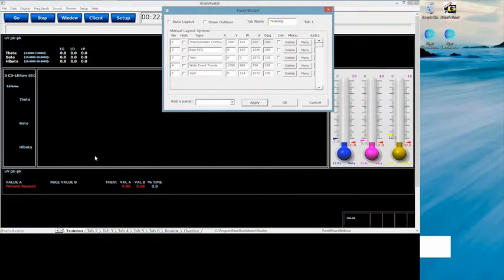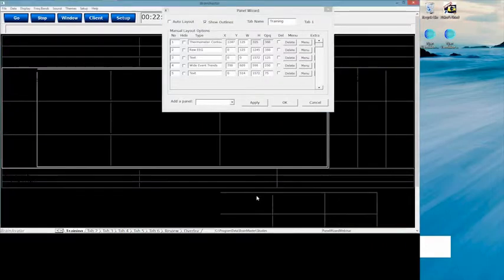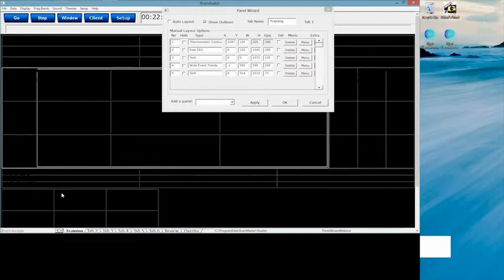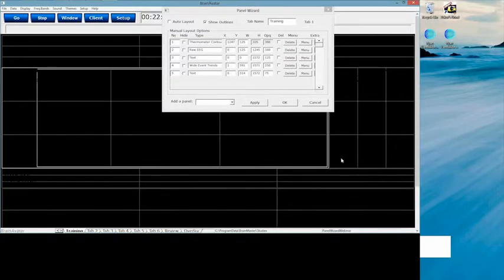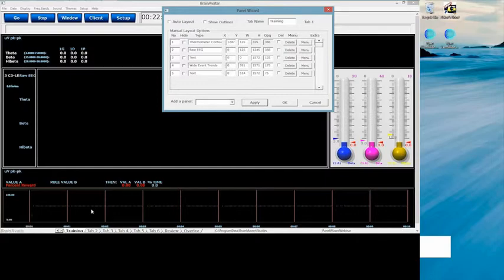So now I've made this a little bit larger. And now what I'm going to do is use this portion right here to fine-tune it by typing in 75 and shrinking it up and squinching it up a little bit more. I'm going to bring this display and we're going to hit that. Okay, so it looks like we'd have to shrink that up a little bit if we wanted both those displays in there. And that's where, once again, I'm going to use this and do my fine-tuning. And there we go. And I had it fit in there.